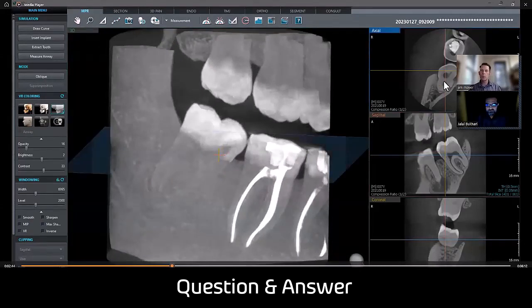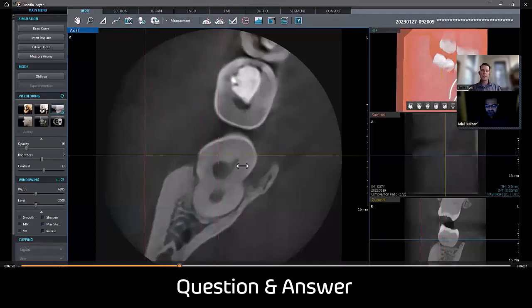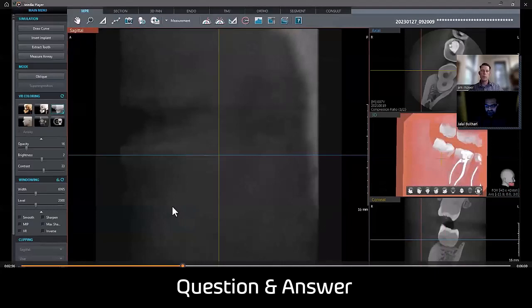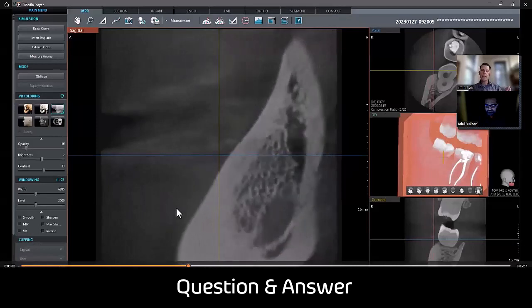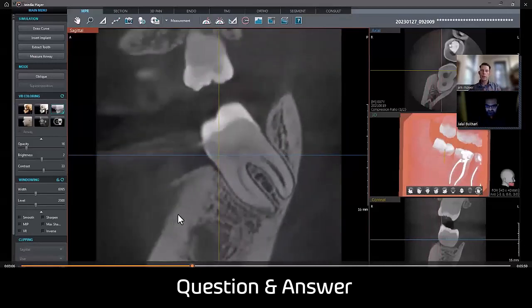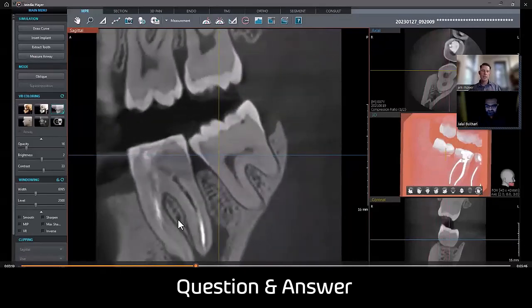And I think we are doing the same thing on this image. We're going to change this to the main window and adjust that sagittal slice to go down the long axis of that ridge to give us that more perpendicular view. And as we scroll through, this is what we did without orientating it. I can still see all those structures you talked about, but how do we really focus in and target that area? And I think we'll see some of that lucency there.